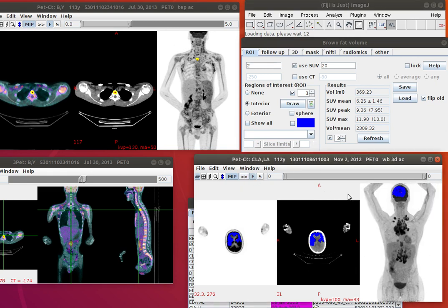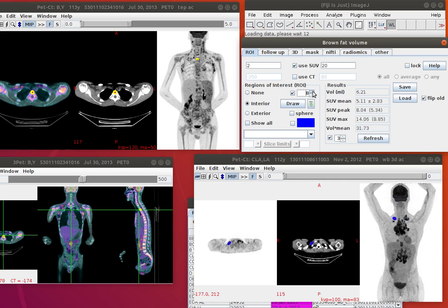And again, if I want to see all the regions, and I'm interested in something in this area. So not to show all. And I'll go through until it gets down to the place I want to, the same organ, quote unquote, which one look at here.